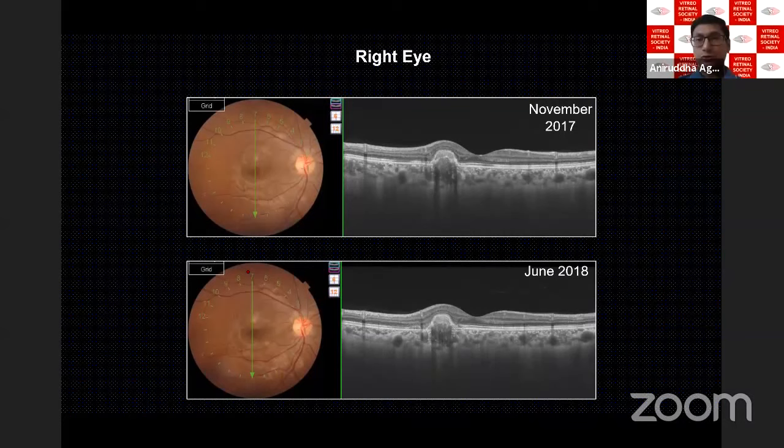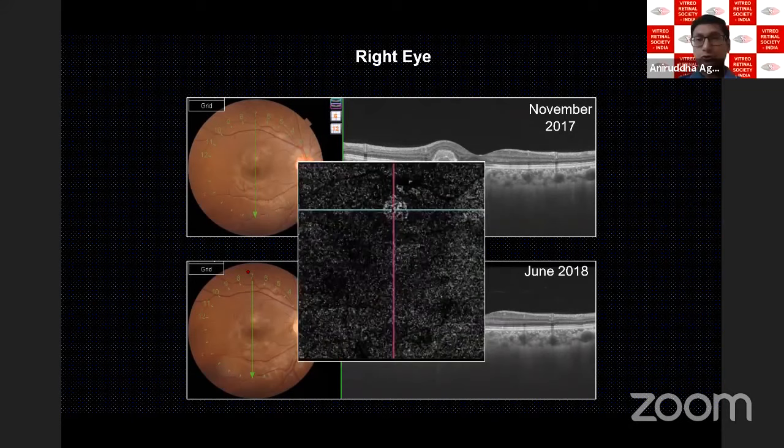However, if you look at the OCT angio, which was done in November 2017, there is a very small network-like picture on the outer retinal slab. This was the same that we observed in June 2018. Of course, like most of us would do, we don't have any fluid, we don't have really a guideline here, and we have not injected anti-VEGF in this patient.